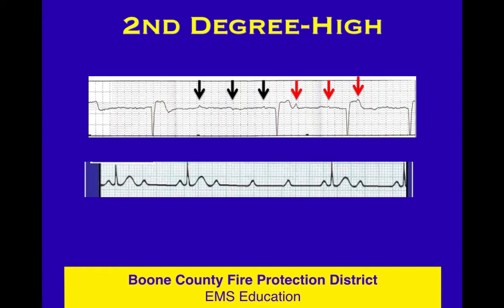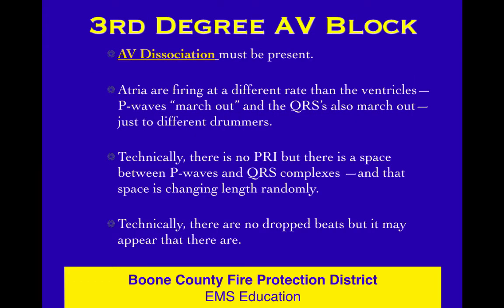This is not third degree block. There is a relationship between some of the P's and a QRS. In third degree block, there would be no relationship. So I don't think this is very common, but it is out there and it's something to think about.